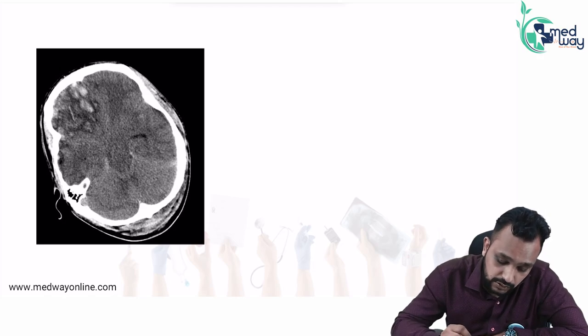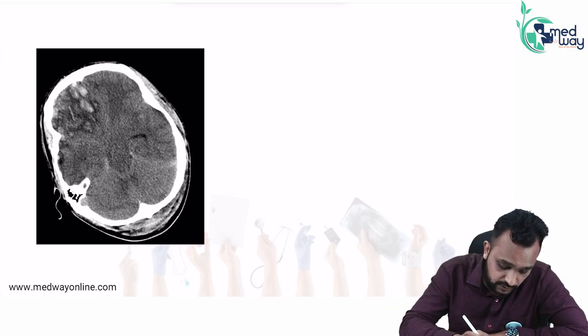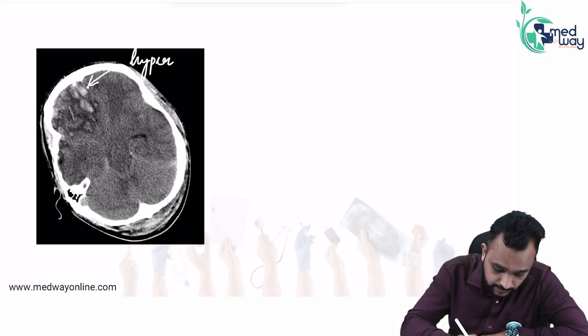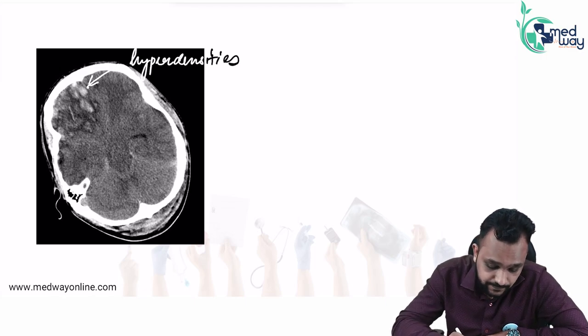Let me show you how this edema looks on the CT images. This is another patient with a road traffic accident. You can see that there are hyperdensities, and these hyperdensities are surrounded by a rim of hypodensity.